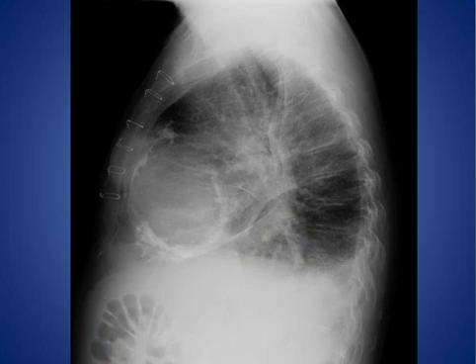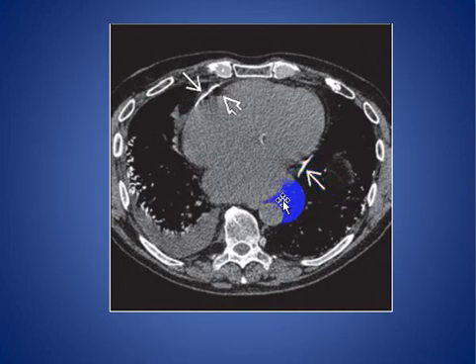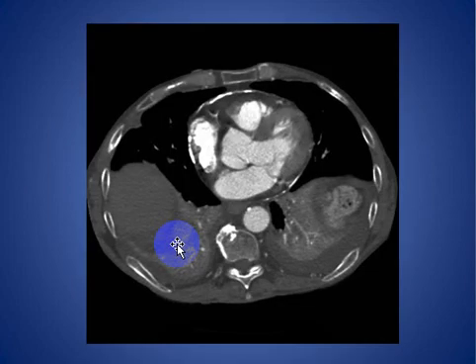Here, this is another patient with constrictive pericarditis, extensive calcification seen involving the pericardium, and the patient also has effusion and increased dorsal kyphosis due to osteoporotic changes. Here, a patient with calcification of the pericardium seen here and here, and the patient also has minimal calcification here. Also, there is a right-sided pleural effusion.